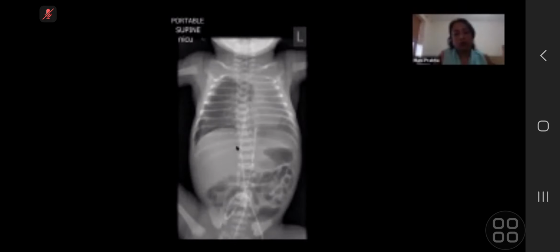So this is a newborn, and a portable X-ray was done. There is increased lucency on right side, and the pleura is projecting to left side with shift of mediastinum to left. And this is a case of pneumothorax. And the UAC is all right. This is optimum position. The UVC appears slightly higher up and needs to be resited or pulled out slightly. Nothing else is significant on this one.